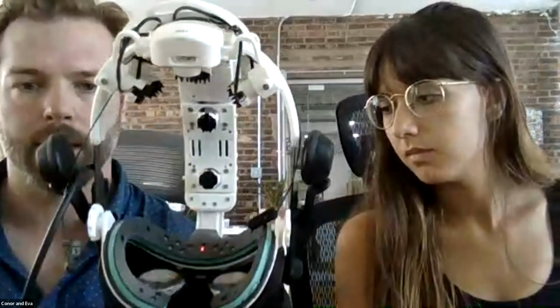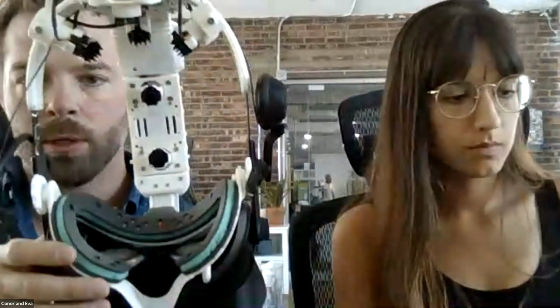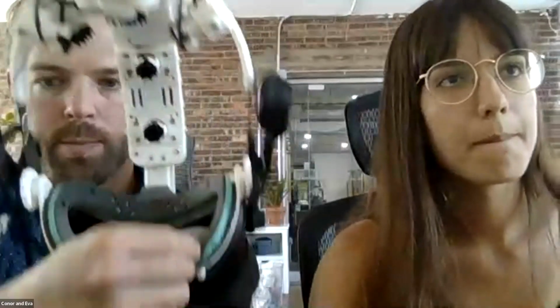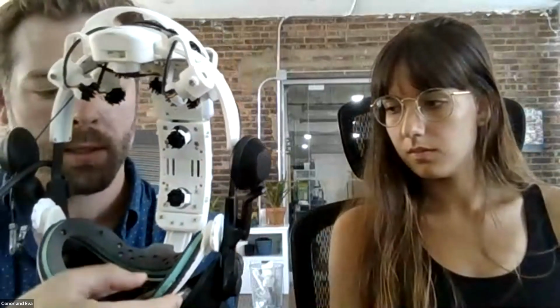All right, so you can see in the headset, we've put a lot of effort into designing this in a way that it is modular, and we have things that are replaceable. This gasket in itself can come off, so if there's an issue with the face interface, it's pretty easy to swap out the interface for a new one. But even within the face pad itself, we have electrodes that can click in and click out. I just popped an electrode out. So if one of the electrodes starts to wear out, you can remove it and replace it pretty easily.